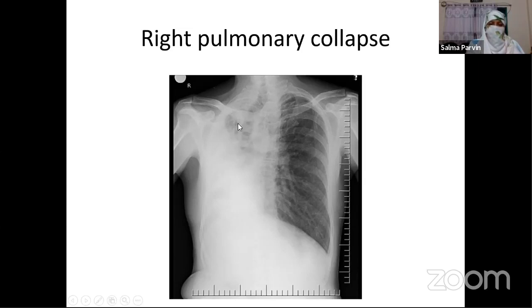There is some part of the right upper lobe containing air in the apical area, but most of the lung is opaque due to summation by the mediastinal shadow and also the collapsed lung superimposed with consolidation.